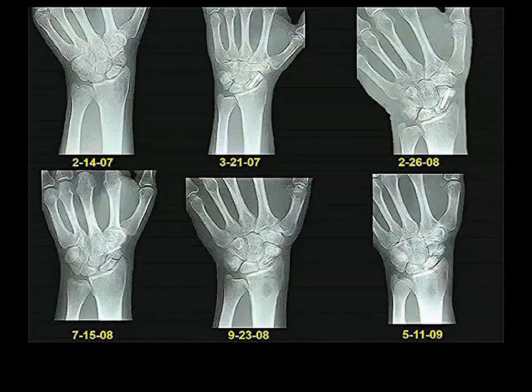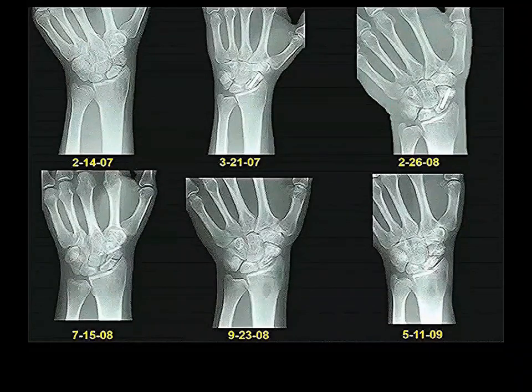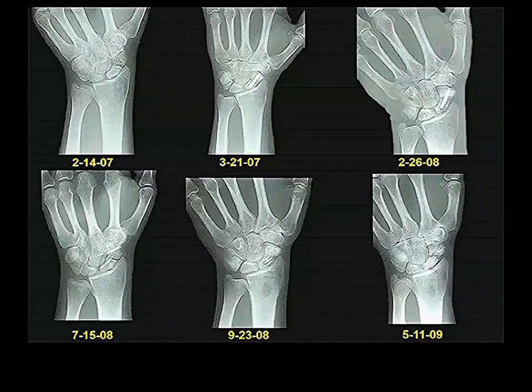Here's a year later. There's still no healing. You can still see a radiolucent area right there showing that the proximal and distal fragments of the scaphoid haven't healed. So then they took the pin out. I don't know whether they hoped something would happen when they took the pin out or whether they just got frustrated. But they took the pin out, and now you can see without the pin how clearly separate distal and proximal fragments are, as separate as they were when the fracture occurred, which was over a year ago for this individual. So then they said, okay, this is not good.